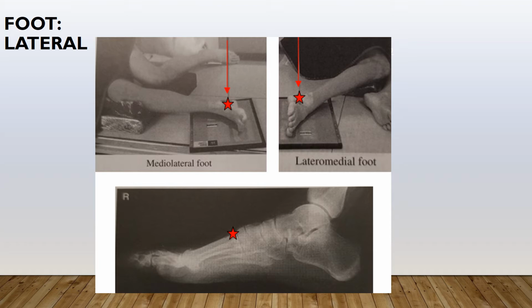Evaluating the image, make sure the entire foot with 1 inch of the distal tibia and fibula are within the collimated field. Make sure you have a true lateral with tibio-talar joint open. And make sure the distal metatarsals are superimposed. And soft tissue and sharp bony trabeculation are clearly demonstrated.